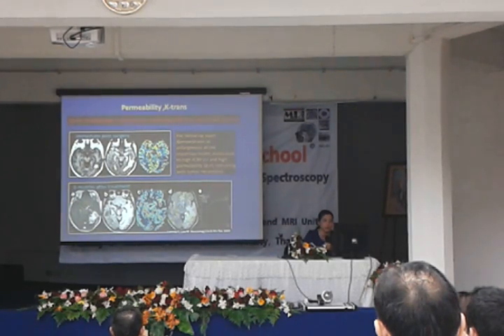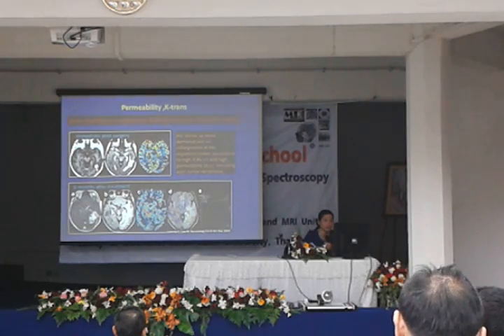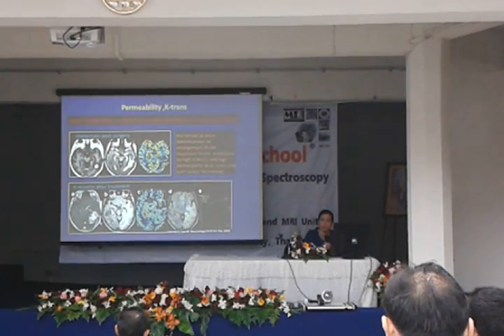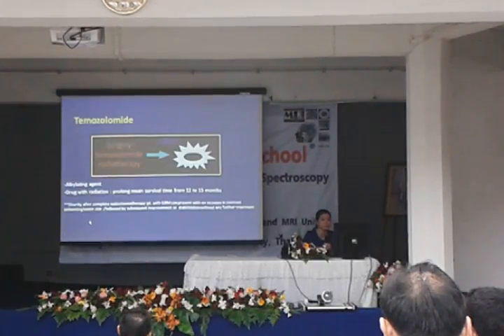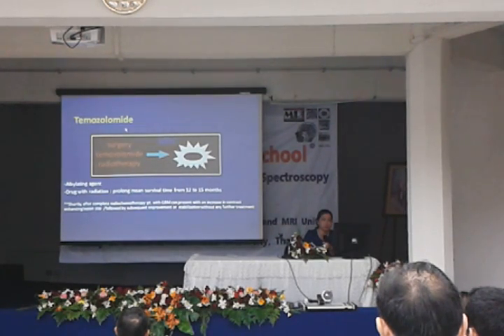In this case, immediately after surgery, we see a small enhancing area. And 6 months later, the region gets bigger, right? And on the K-trans we saw very high permeability, which confirmed the diagnosis that this one should be recurrent tumor. And for the drug used to treat high-grade tumor, temozolomide can have an effect. After complete treatment, the mass can increase in contrast enhancement and also increase in size.